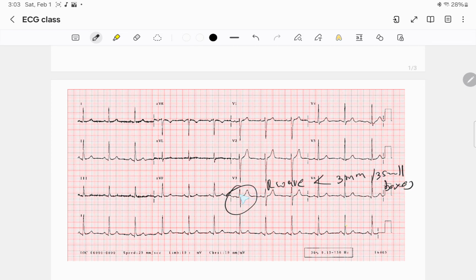So what we're saying is if the R wave is really short, meaning it's not progressing normally, it's taking really long to reach the transition point, then that's abnormal R wave progression. And that's all we'll really say about that for now. Many different conditions can cause abnormal R wave progression, so it's not limited to ischemia and infarction. However, I'd like to take a second to explain the physiology behind normal R wave progression.